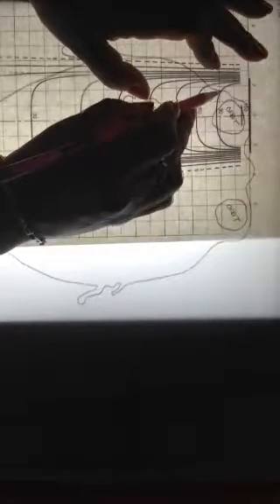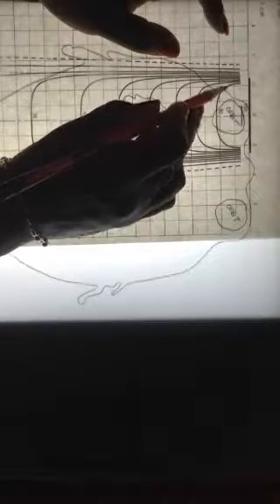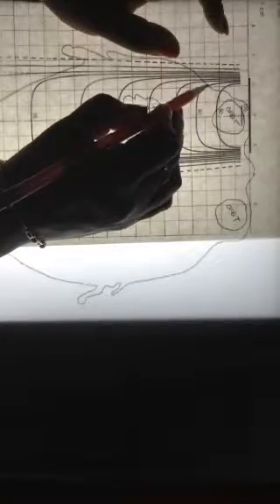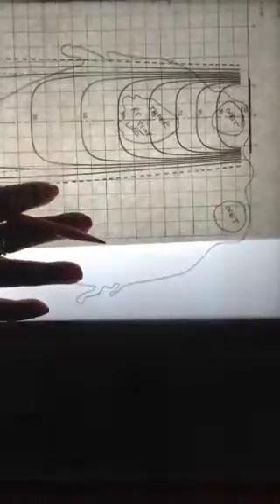The 100% dose line is just flat. The 90% dose line is here. You can trace it all the way over if you like. Although each of these dose lines represents absorption and scatter, so outside of the tissue there's really nothing happening, we need reference points for this exercise. So I'm going to trace each line. Okay, fast forward. I've already done that ahead of time, so I can show you what that looks like.